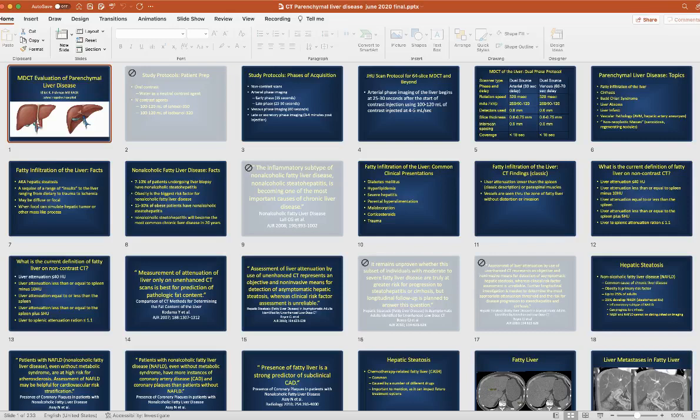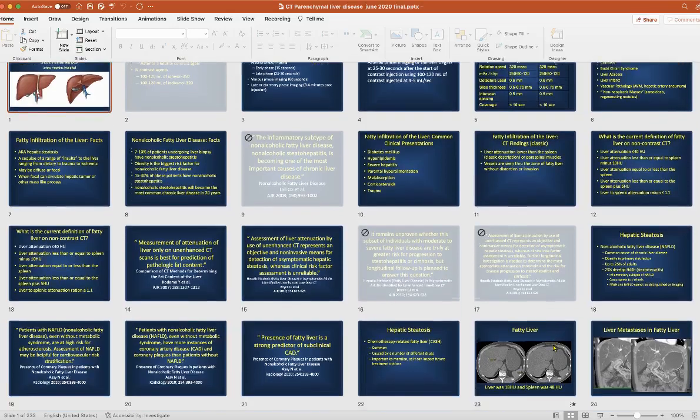You may often see areas of AV shunting in patients with parenchymal liver disease. At times it could simulate other processes, even malignancy. How do you know you're not dealing with a small hepatoma? But usually when you look at images, particularly the MIP images, it makes it fairly easy to tell the difference there.